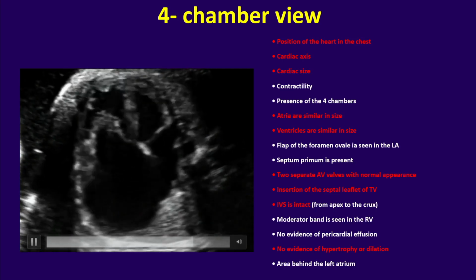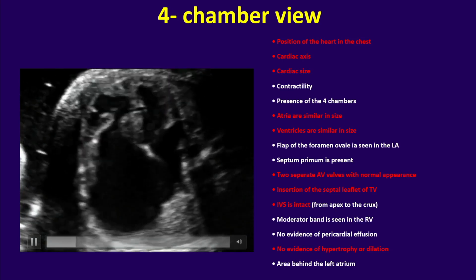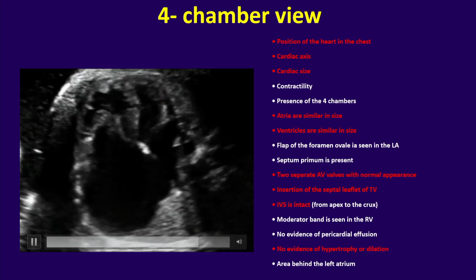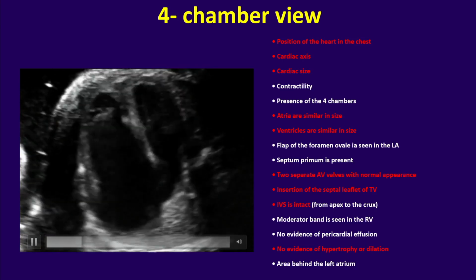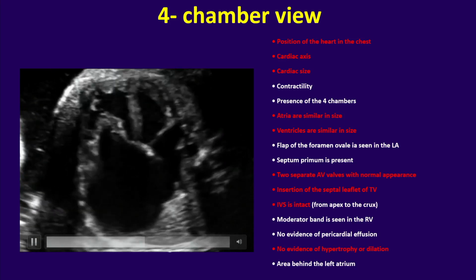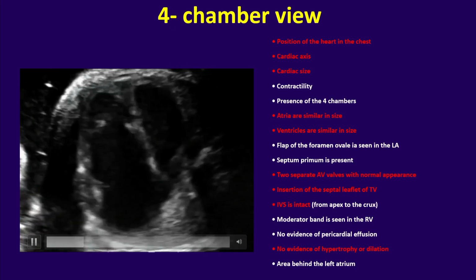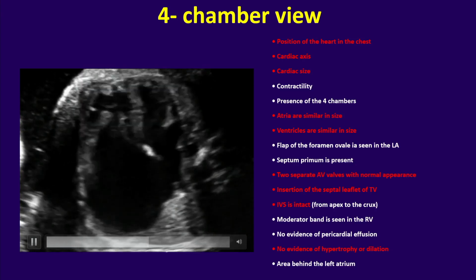And what really jumps out at you right away is that the heart is significantly enlarged. So the heart pretty much occupies the whole chest here. And as Dr. Abu Hamid pointed out in his talk, you're supposed to be able to fit 3 hearts of that size in the chest. And it's definitely not possible. I think it's actually very tight for just this one heart in that chest. So we deal with cardiomegaly.